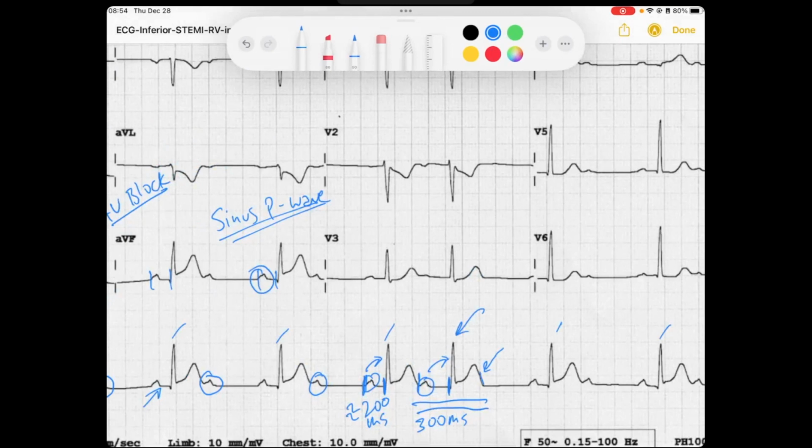And then what you'll notice is the next P wave, if you look just right there, there's a little notching on the T wave that likely represents a P wave that is superimposed on that T wave. And you can always compare the previous T waves where you have a nice smooth T wave, very smooth. So always compare to previous T waves. And so my PR interval is lengthening and lengthening until it drops. And so this is a second degree type 1 or a Mobitz 1 or Wenckebach AV block.